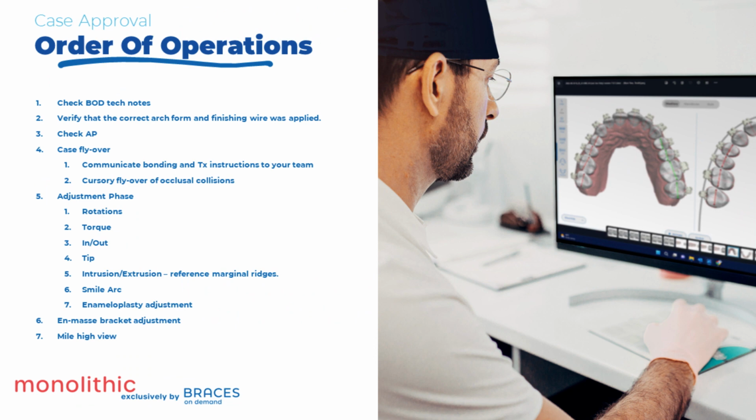Congratulations! It's time to step back and take a mile-high view of your setup. All of your hard work is about to pay off. We encourage that you practice and master our strategy before you adapt it to your own needs. Try to commit a keyboard shortcut to memory each time you approve a case.